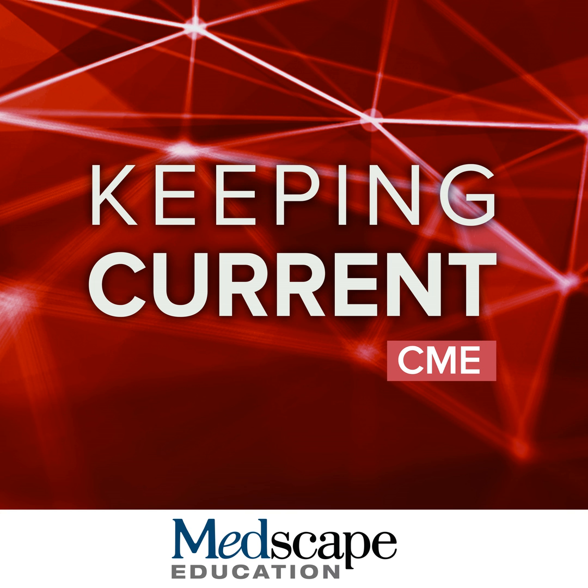We also have a 3D viability imaging technique, as shown here, where you can cover the entire heart with 3D. Takes longer to acquire these images. The image quality may not be as good. This may be useful, for example, if you're really looking for small amounts of thrombus in the heart or looking at the left atrial appendage, for example.